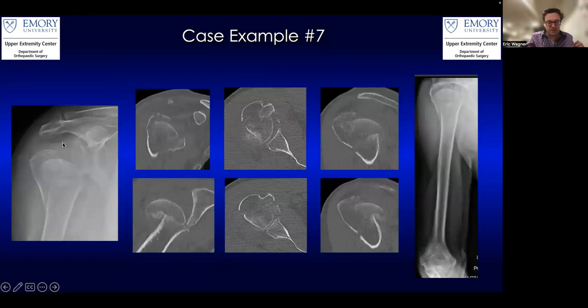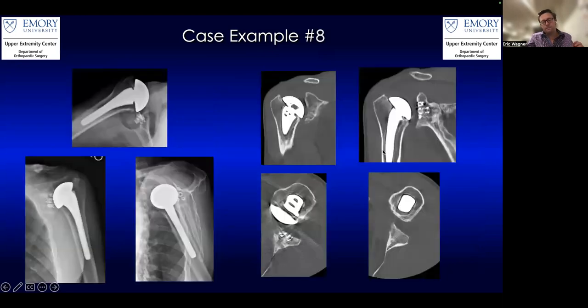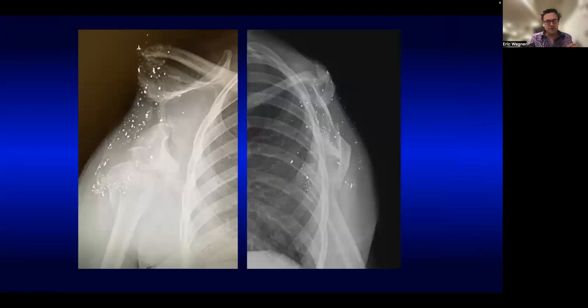This is a proximal fracture. So greater tuberosity back here. This is the humeral head. And there's an example you don't want to see after a shoulder replacement. Subluxed anteriorly in the scapular Y. So here's your Y. It's sitting anteriorly here. You can see also it's sitting anteriorly here. So something you hopefully don't want to see after shoulder replacements.